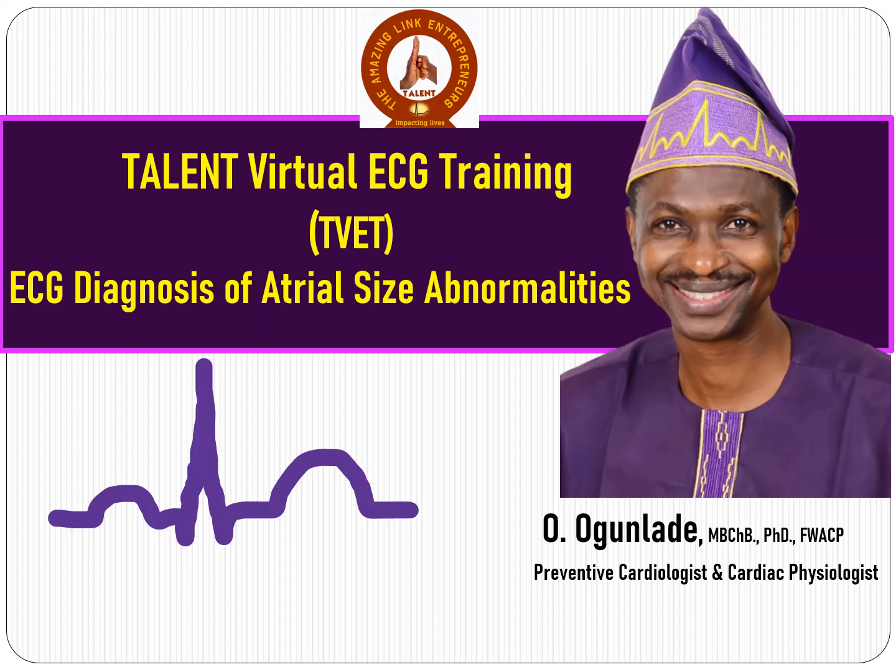This video focuses on ECG diagnosis of atrial size abnormalities. I am Ogunlade, and at the end of this video, the viewer should be able to understand how to use ECG to diagnose right atrial abnormalities, left atrial abnormalities, and biatrial abnormalities. In doing this, the focus shall be on the P wave.